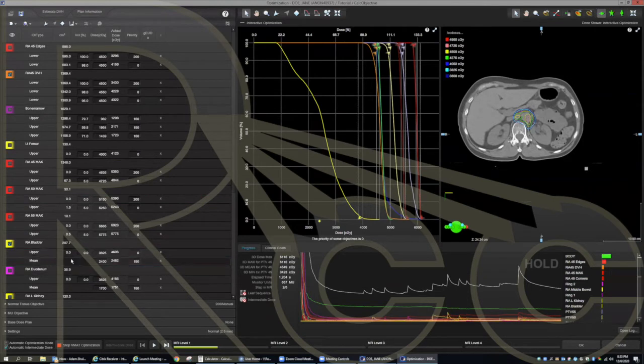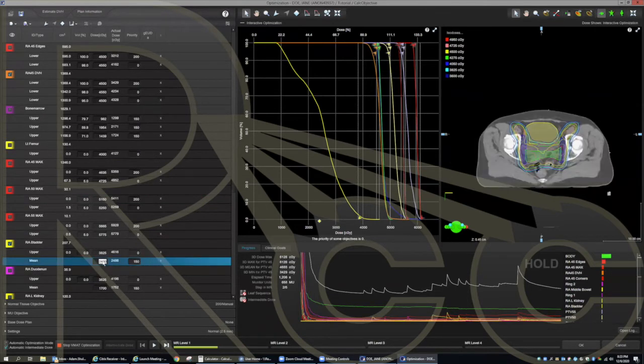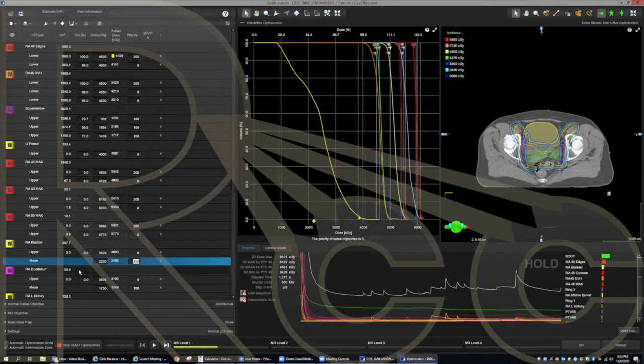Okay. I'll just start tweaking again. Now you guys are probably getting bored on the other line. Like, Adam, we get the point. It's good to watch. Yeah.